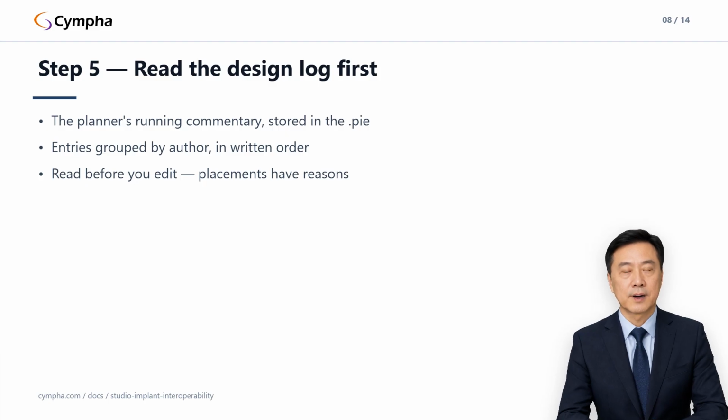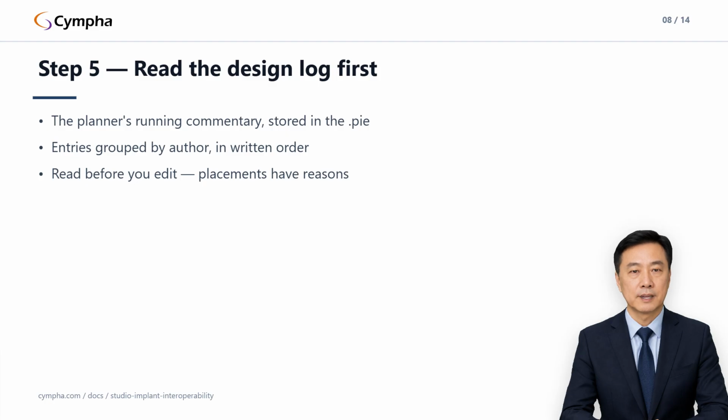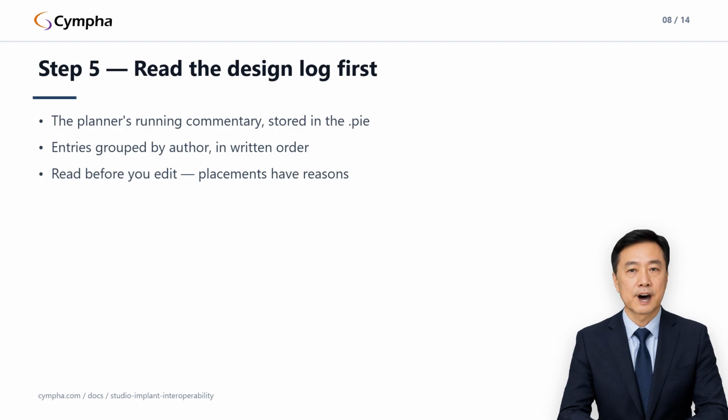Then click Add, watch the status line prompt you to click in 3D or a slice view, and click the site. The implant appears with its sleeve at the clicked point, and you refine with the gizmo in 3 dimensions or on the slice panes. For an existing implant, click its row in the model's browser to make it current, edit the fields, and click Update to regenerate the geometry. Same rule as always, Update stays disabled while a placement is pending, so finish any outstanding placement and click first.